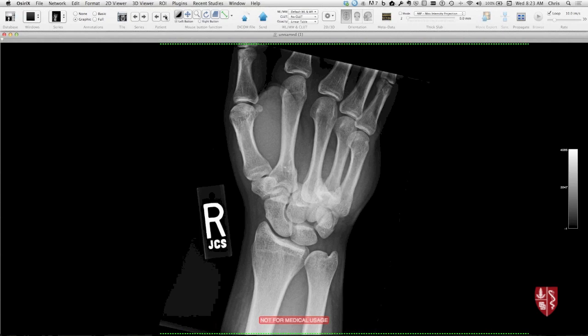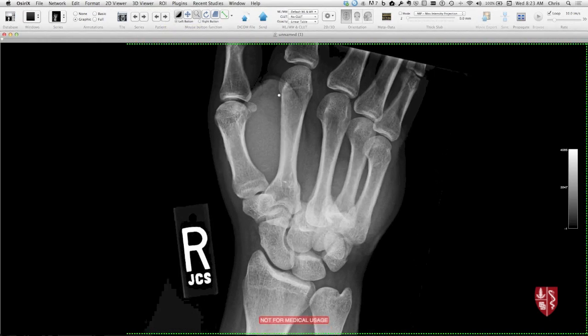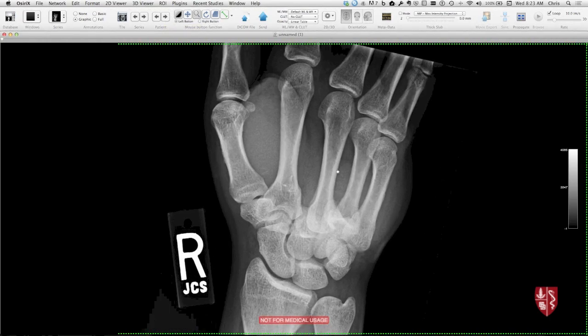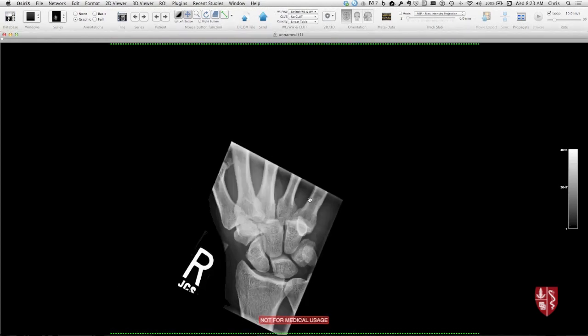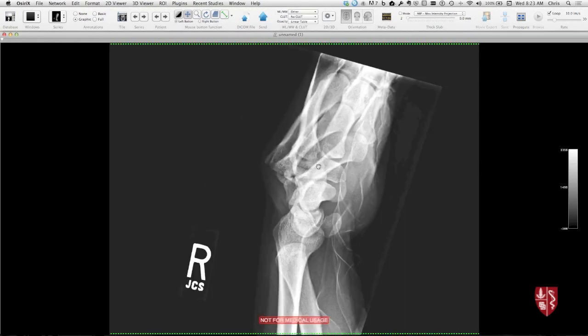Perhaps similarly in this case, this is a little bit of an atypical or less common injury, but if we look at the PA view, what do you see here? Distal radius, ulna, pretty good, right? Proximal row, pretty good. Nice alignment, no major malalignment. Distal row. Look at this carpo-metacarpal junction. Here's a different oblique view. But look at the lateral view in this patient.